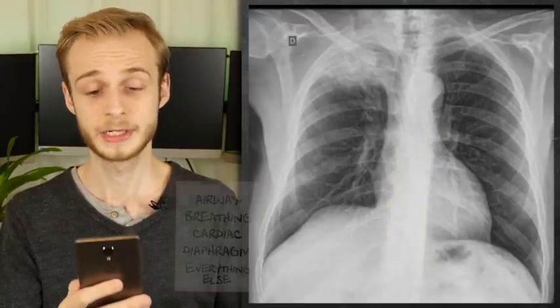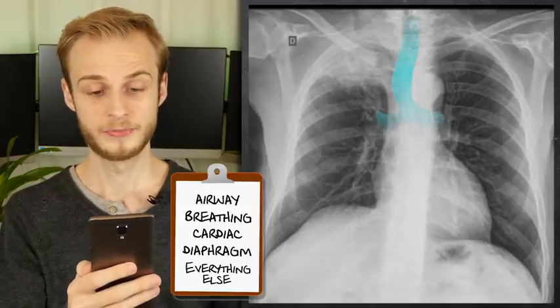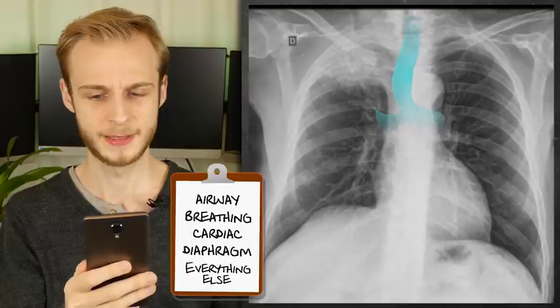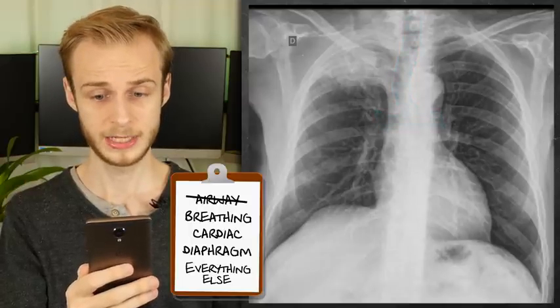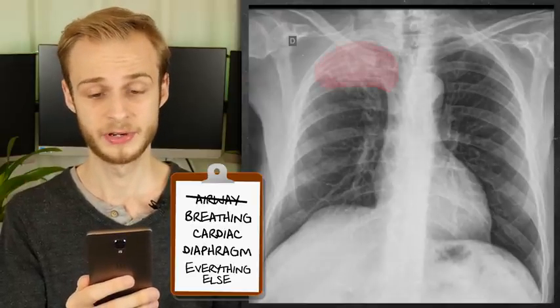So now we're on to our clinical assessment. The trachea is deviated towards the right side. The bronchi are obscured and a bit difficult to visualize in this case. The left lung looks normal to me, no obvious consolidation or opacities. There is, however, a large, well-defined opacity in the apical zone of the right lung.